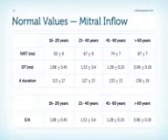So here are the different parameters we can assess with the pulse-wave Doppler: the isovolumetric relaxation time, deceleration time, A duration, and the E to A ratio. You can see that the normal values vary with respect to age.